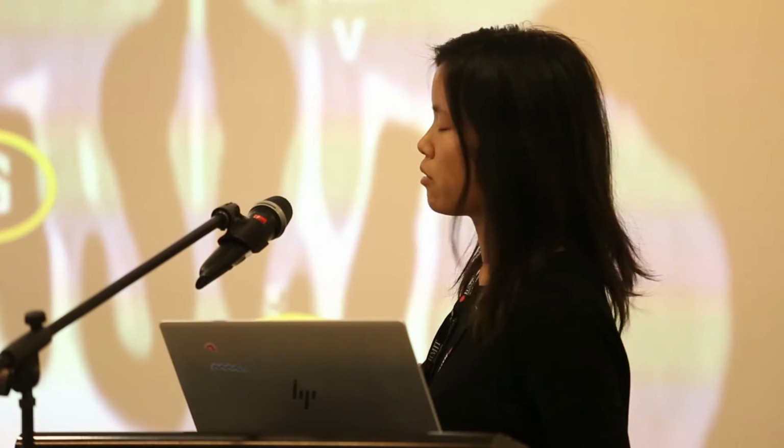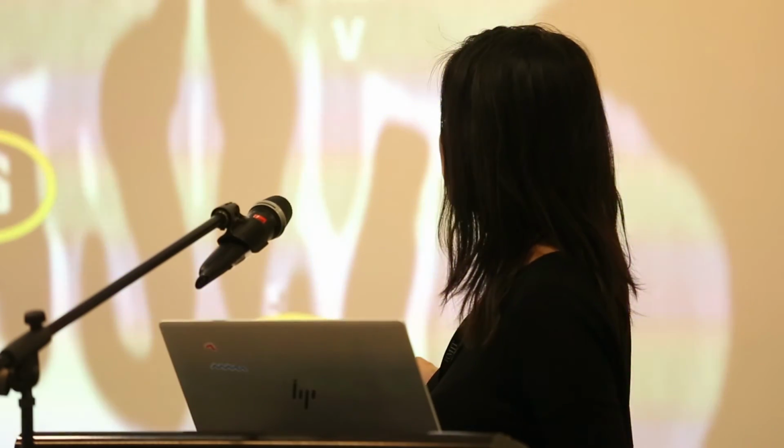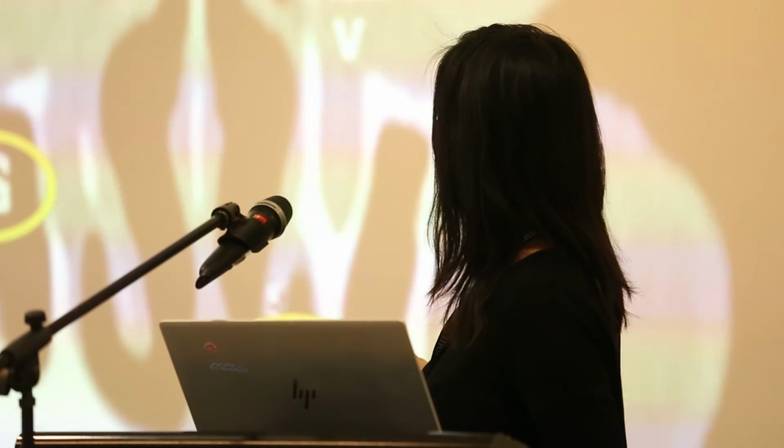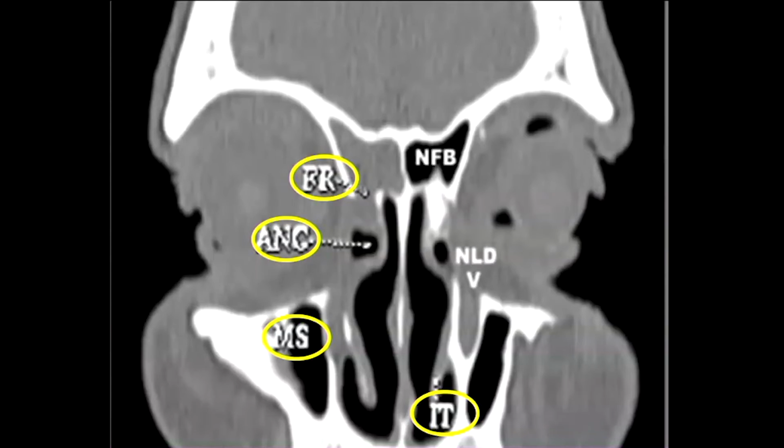So when we operate on the frontal sinuses, that's one of the areas that we try to widen when someone's got frontal sinus disease, and it's actually a really tricky anatomical area even for surgeons to figure out. And then this here, ANC, it stands for agger nasi cell. Basically, people call it the most anterior ethmoidal air cell. And so the ethmoidal sinuses are the sinuses that are in between the orbit and the midline, the septum area.